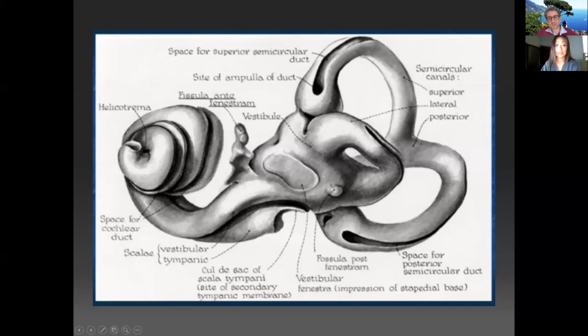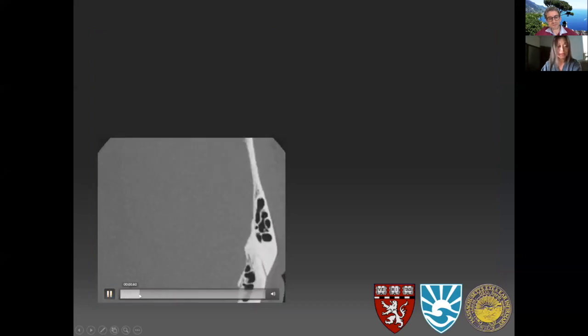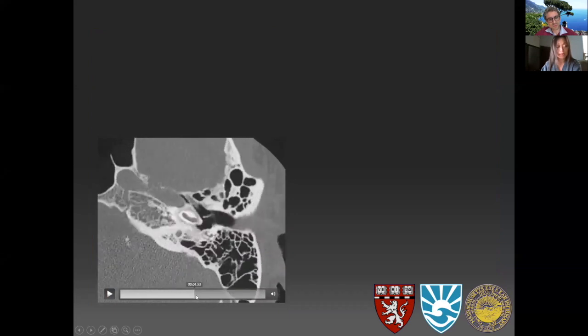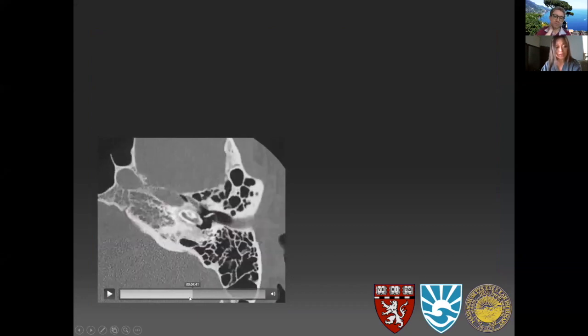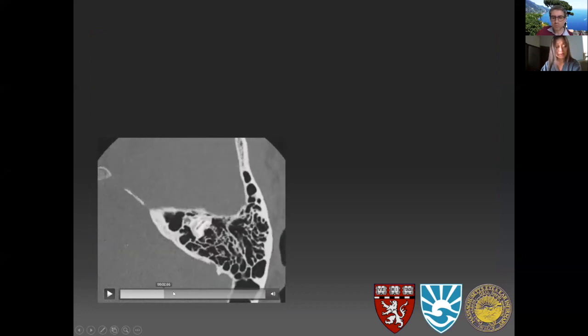Okay, so here is another patient, and the clip shows, again, this abnormal lucency that looks like a halo, and it's following the rules. It's around the cochlea, the edges seem to be okay, and it goes all the way around the semicircular canals as well.